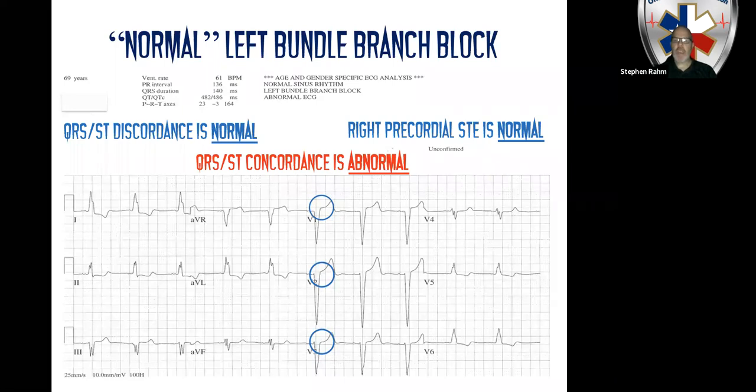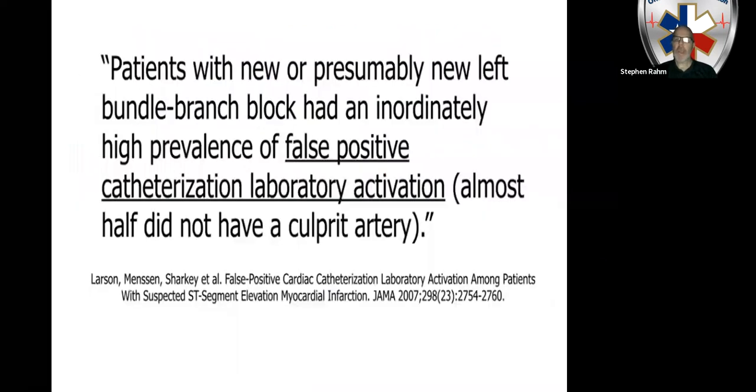So what this EKG is showing you is a pattern of appropriate discordance. Now, let's look at a little bit of background on why left bundle branch block is no longer considered to be a STEMI equivalent. This was published in JAMA back in 2007, a study that found that patients with new or presumably new left bundle branch blocks that went to the cath lab in this cohort of patients had an inordinately high prevalence of false cath lab activations.